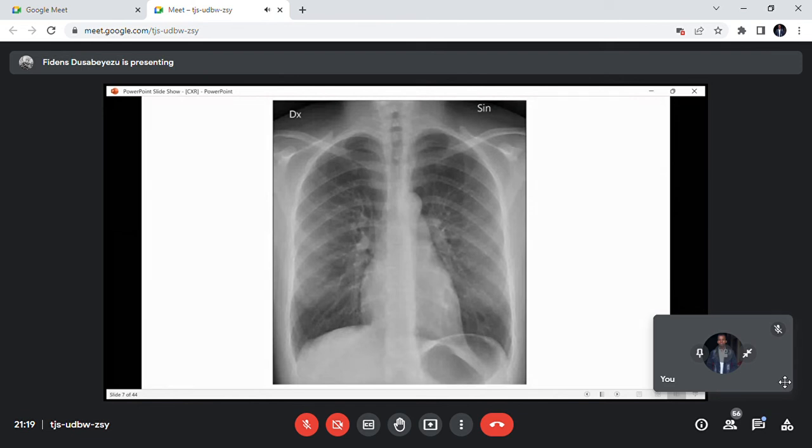But number 2 as a component is blood vessels. The vessels, lung vessels. Number 3. Let me ask you before you say number 3.